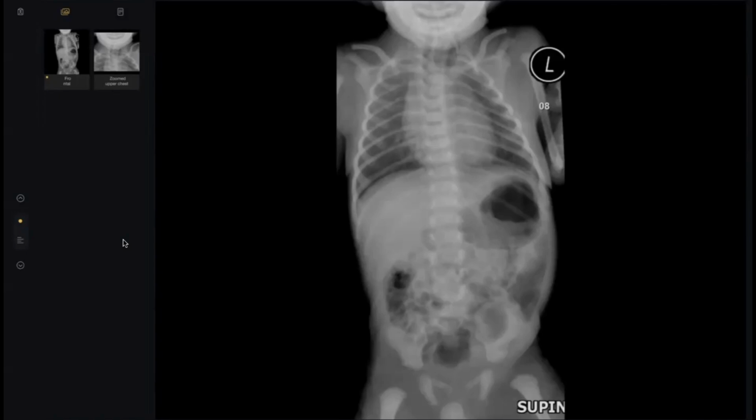Doctor, do you remember the mind map that I just described for all of you in any babygram? Please tell me about it. Enumerate when you are presented with a babygram. 1, 2, 3, 4. 4 things. And tell me from up to down. Okay, again, sorry. So firstly, about the lines, I am able to see likely a feeding tube that is malpositioned.